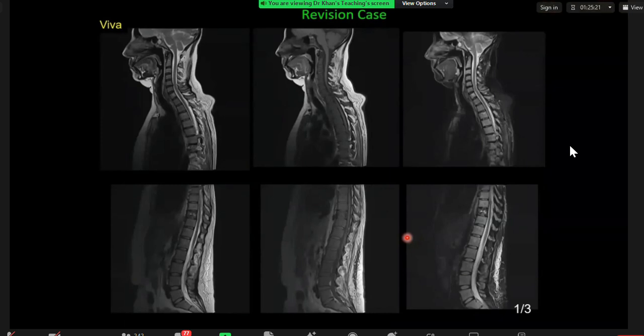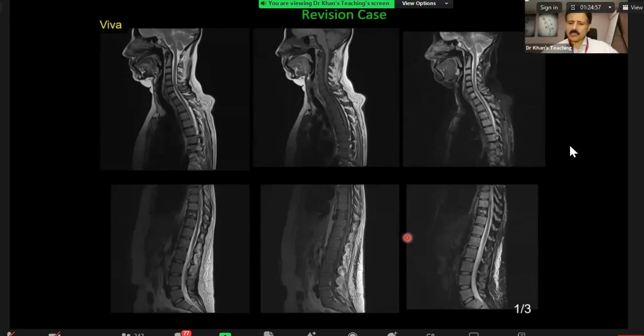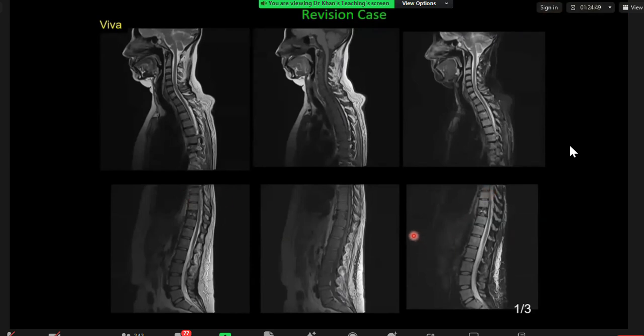On the T1 weighted sequence, I think this is a relatively middle-aged person. There's significant loss of T1 signal, and there's fairly high T2 signal. So I wonder if this patient has got a global pathology, for example, significant infiltration of the marrow. Which sequence? You said there is high signal on T2. On T2, this one or this STIR? I meant a STIR, yeah. And there's no signal on T1.